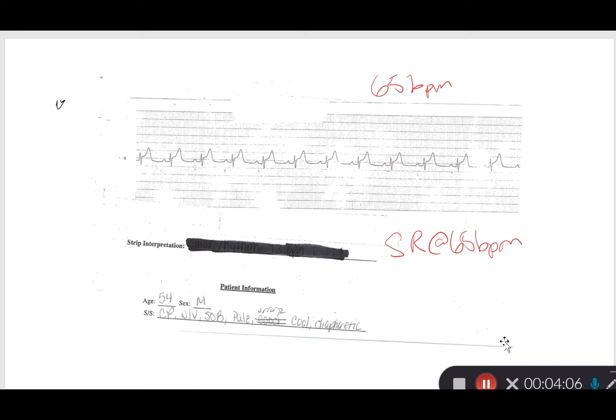One thing I notice about this rhythm is it looks like I have some ST segment elevation. So looking at my QRS, it ends there. So I marked where it began and I marked where it ended. And you can see where it ended, it is above that isoelectric line. Wow, that's a really bad line. So if I was to draw that line, my isoelectric line, you can see maybe over here where I didn't butcher it as bad. You can see where it begins and my J point where it ends. So I have some ST elevation.